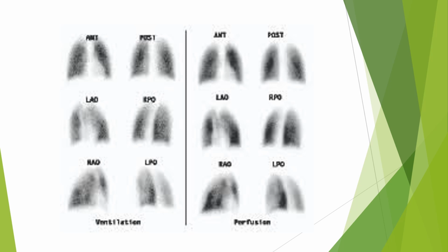And this is the same thing, just a different way of looking at it. You might see this where they have the anterior picture and the posterior picture, left, right, and so forth. So you can see it in further detail. You can see the lung, and this is just the cutout of the heart there. The cardiac notch right here. Posterior, and then you can see a little bit of the cutout of the heart.